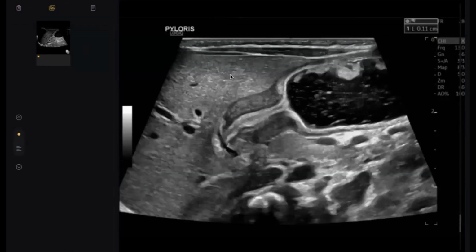These are grayscale ultrasound images of the upper abdomen and pylorus of a 3-month-old baby with a history of vomiting. I can see marked thickening of the gastric pyloric region, forming a cervix sign, and hypertrophy of the central gastric mucosa. It measures more than 16 mm, and there is dilatation of the proximal stomach showing food residues. These findings are suggestive of hypertrophic pyloric stenosis.